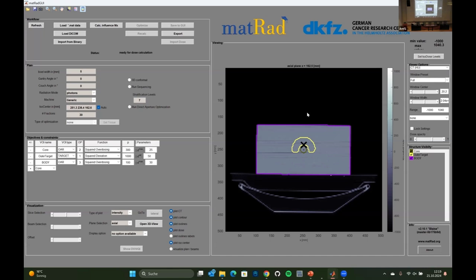We already have the capability to optimize now, so we are a little bit more resourceful than the initial engineer I had, or the initial clinical medical physicist. We could now come to the clinical medical physicist who gets all of these things provided, and they just want to start: how does this photon beam look like? Maybe they also just want a photon irradiation for quality assurance. So they already went to the data loading step, loaded their phantom, and then they set some parameters.